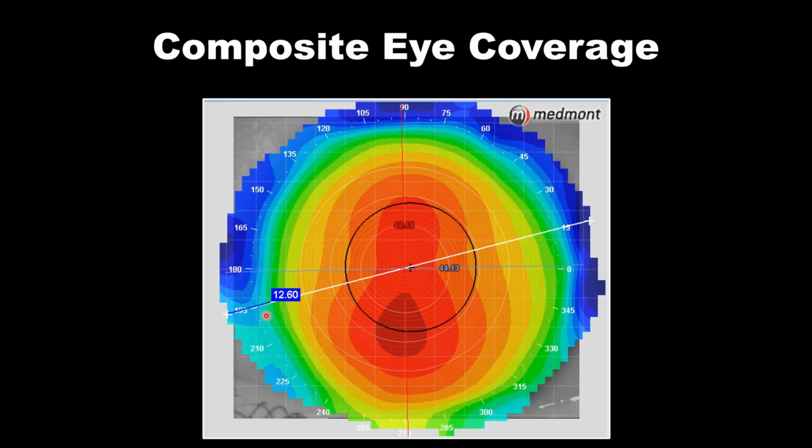Now, do you need to do a composite map for a screening? Patient comes in with slightly reduced quality of vision. Maybe they're not able to get quite to 6/6 vision. So you want an assessment of what's happening within the pupil, and whether there's any apex that's decentered from the cap of the cornea. Now, you really don't need a composite map for that. The extra imaging, the time that it takes to take the composite isn't that much greater, but nevertheless, we just want a screening. So in that case, just do a single topography capture.